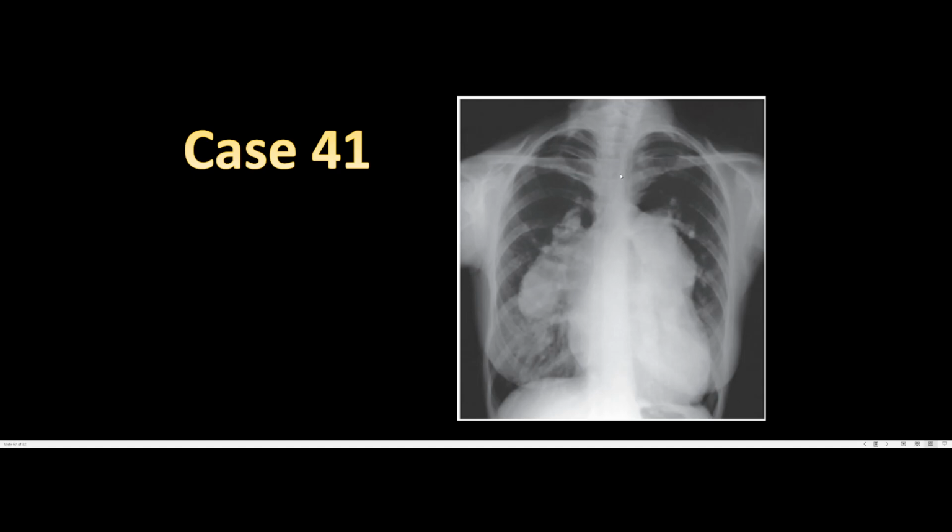When there's so much blood expanding the pulmonary blood vessels, which are found in the hilum, by the way, you will have the appearance of bilateral pulmonary hypertension. And notice how they look different from hilar lymphadenopathy. They're much bigger in appearance. They're not lobulated in appearance. They're much bigger and they're going outside, going to the periphery. They're going concave in appearance.